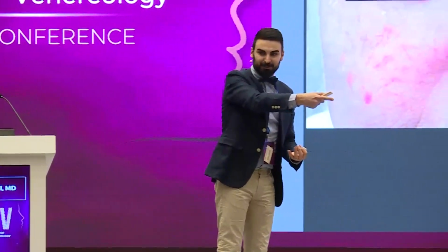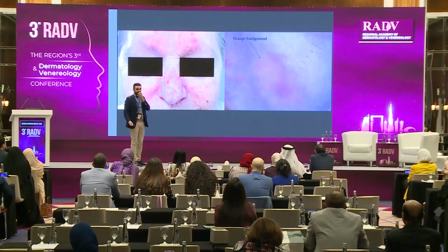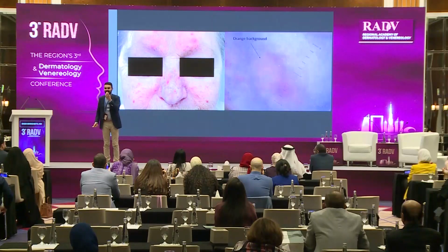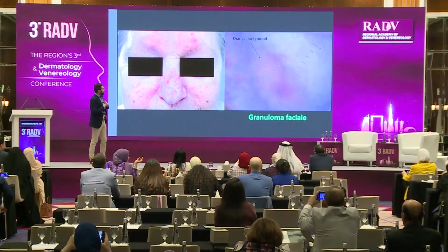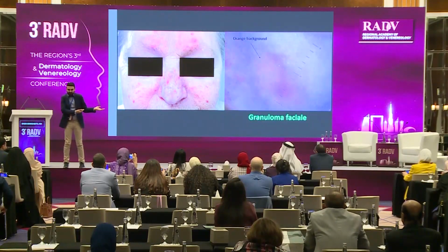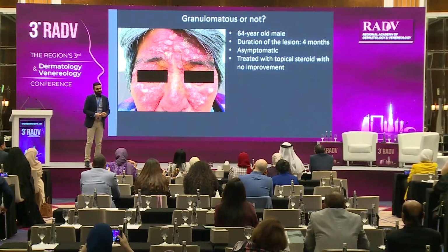So we are in the other group of conditions in which orange is due to hemosiderin. So on the face, granuloma facciale, okay? An atypical presentation, I agree with you, but this was a granuloma facciale. Of course, we took a biopsy.